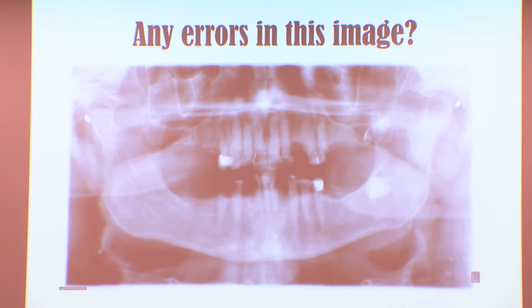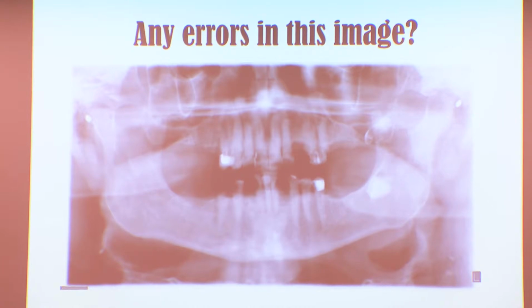Rotation to the right. Everything else looks pretty decent, except for the hearing aids in there. Not a huge problem. Yep, hearing aids. The head was tipped a little bit too.